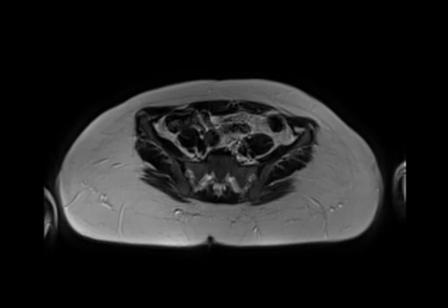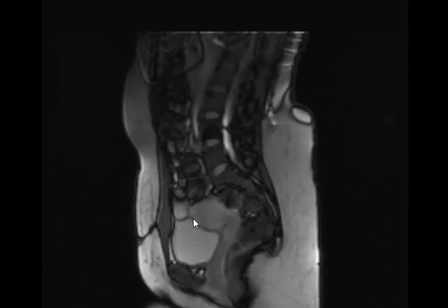Leave the mouse. Now, let's continue. You didn't finish, that's the problem. You have to see everything. I'm giving you information. Don't hurry up, make full use of it. Continue. This is the localizer.